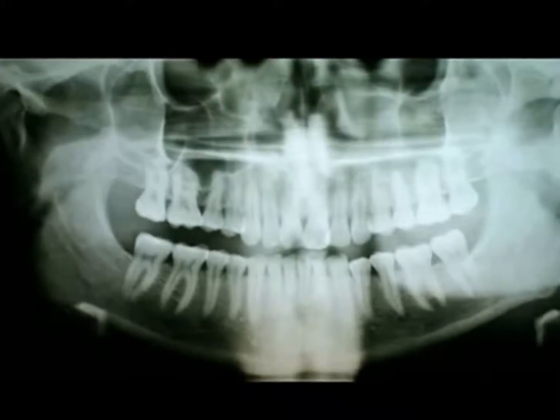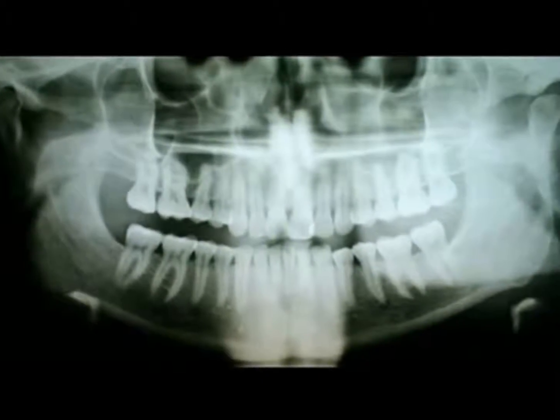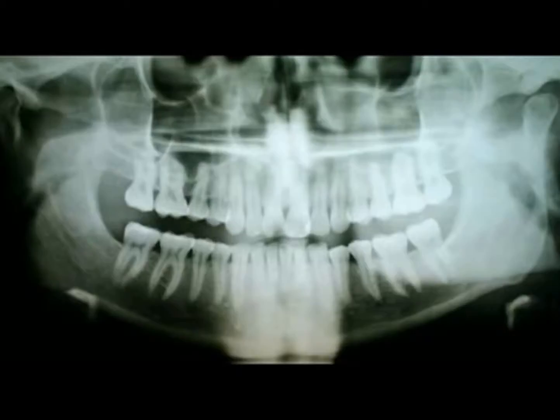Let us forget about the joint for now and take a look at the lower jaw. You can recognize the teeth, and if you take a good look, you can see a dark strip running almost the whole length of the lower jaw. Dark means that the X-rays go through, so this area has less bone. It contains a nerve in a hollow bone canal. This nerve gives the lower jaw feeling, and when the dentist gives you a shot and your lip starts to feel numb, it is this nerve which goes lame.